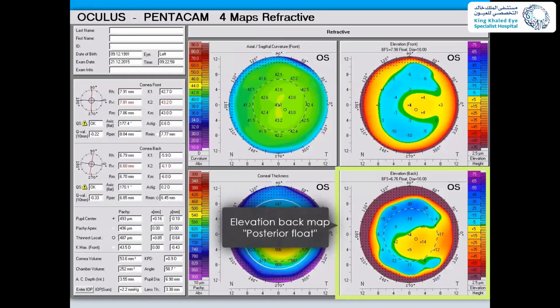it is progression. So let's suppose the patient has 487. So 3% of 487 is almost 4.87 times 3 is 12, 13. So if it is more than 13 micron difference, so people take 15 micron as a standard. Anything more than 15 micron is taken as progression. But again, you have to repeat it. And again, it depends on the percentage. Anything more than 2 to 3% is a progression.